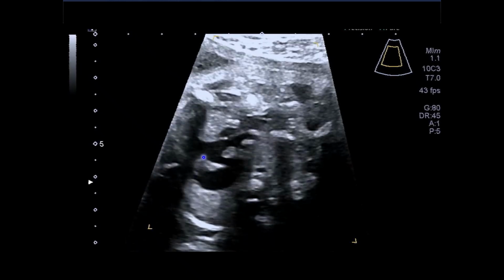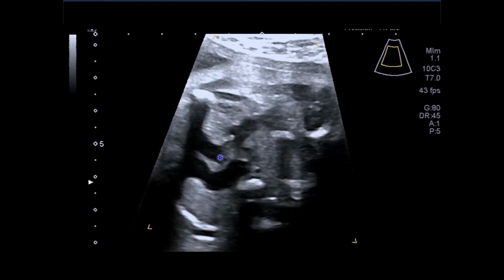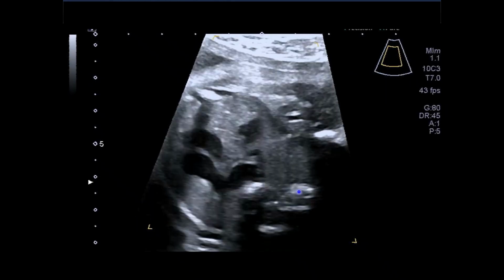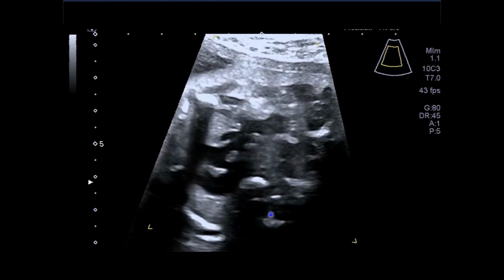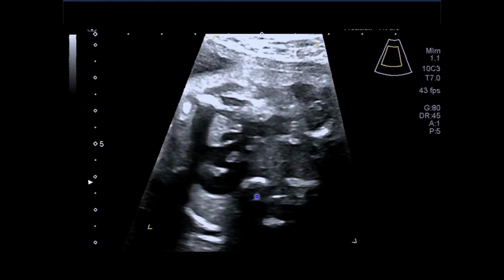And the pulmonary artery sling can cause severe compression of the trachea, severe airway obstruction. In most cases, you have complete tracheal rings, which can be an emergency postnatally. The airway can be quite compromised.